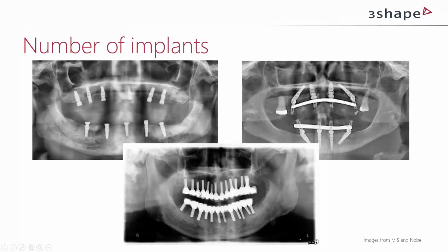So this is also a solution, very nice and straight, but maybe too many. 1 implant per tooth, very nice, very nature-like, but maybe too much, because here we have other problems like hygiene, of course cost might be a factor, but let's not talk about that here, and also the nourishment of the bone between the implants.